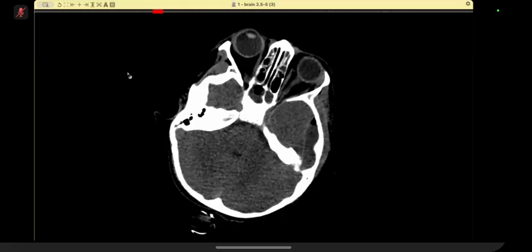In the soft tissue window, there is an epidural collection, and there are air foci seen non-dependent, which could represent epidural empyema. So if there is a contrast study, I will see if there is enhancement or diffusion restriction, to differentiate a simple collection from empyema. Okay, thank you.